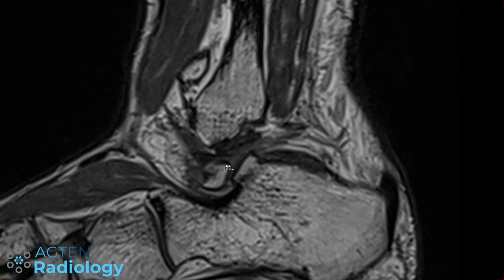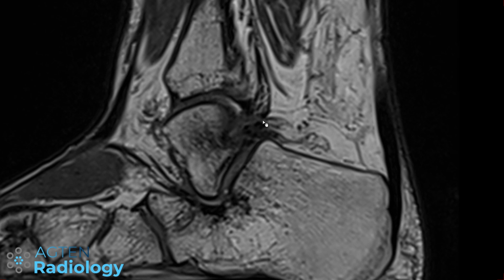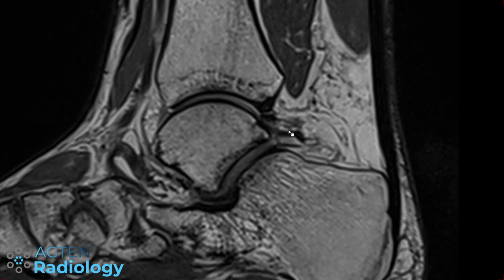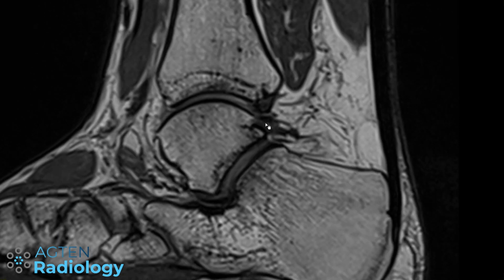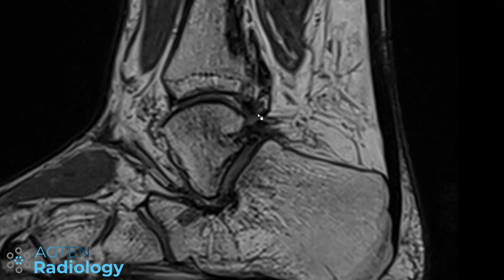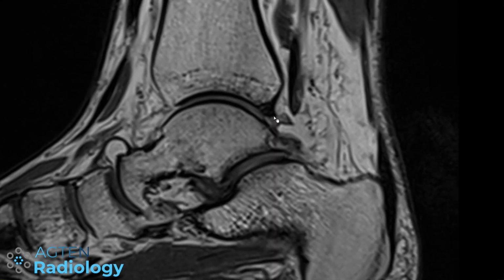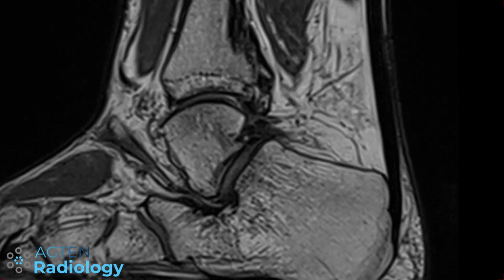So you can see here we have the fibula, and then from the fibula the PTFL, which is running over here, and part of it is inserting onto the trigonum here, and the other portion here, which is the intermalleolar ligament, is then going up here, and then we have this very dark lip here from the PITFL, the deep layer, which is going all the way over here, but basically they look quite unremarkable, to be honest.